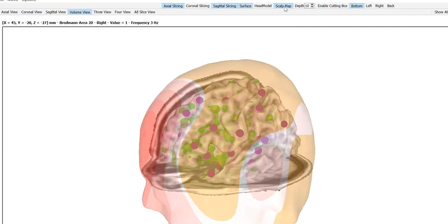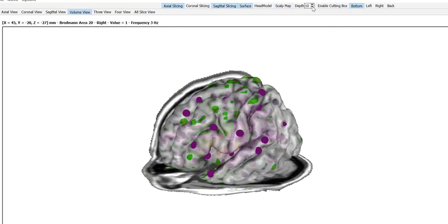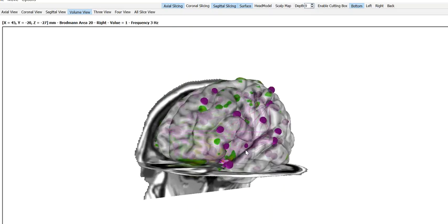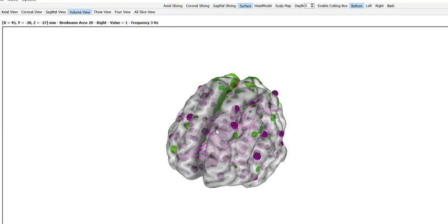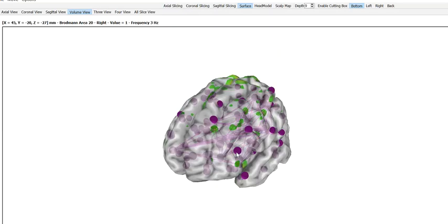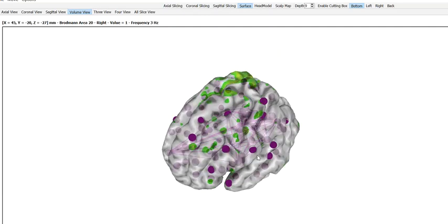And then we also will have effective connectivity, which is the magnitude of information flow between these different nodes. We can also go with swLORETA from the surface of the cortex down to the bottom of the cortex in 10 steps. And so this is an introduction to these new capabilities we're building with functional and effective connectivity.